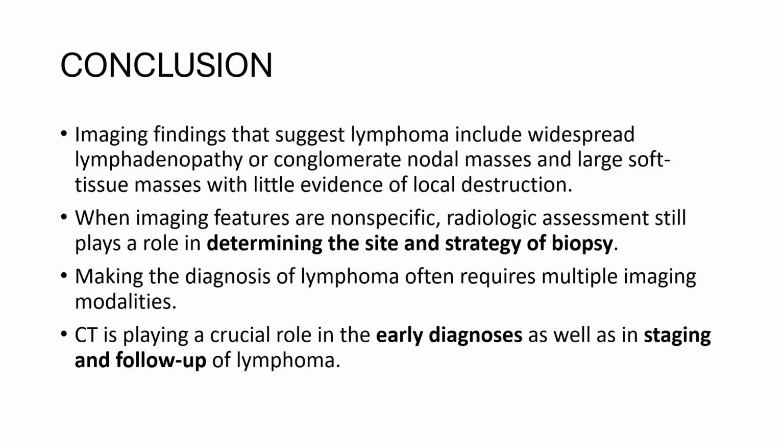In conclusion, imaging findings that suggest lymphoma include widespread lymphadenopathy or conglomerated lymph nodal mass or large soft tissue mass with little evidence of local destruction. Even when imaging features are non-specific, radiological assessment still plays a role in determining the site and strategy of biopsy, as we have seen in the cases shown here.